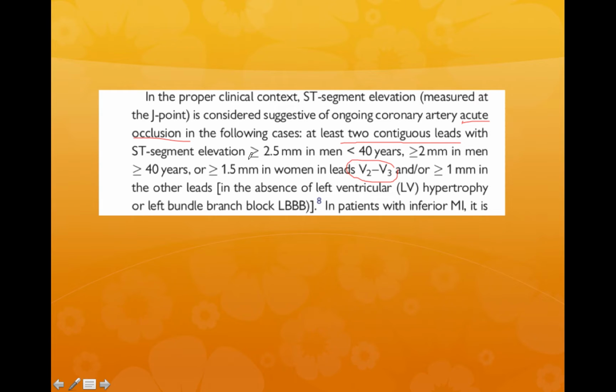For men under 40, you need greater than 2.5 in those leads. For men over 40, greater than 2. And for women, you need greater than 1.5. We're not going to focus on this today. We're just going to focus on all the other leads and just greater than 1 millimeter in 2 contiguous leads. So that's what we're going to be looking for.